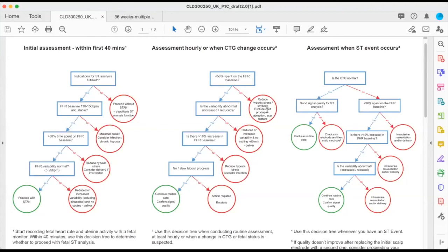There are many, many situations where we're not necessarily in a perfect world. Ideally, I need to have a check every minute. Okay, so I need to have a cross within every minute. That's the ideal situation, or in many books, the minimum situation. If you are having gaps in between your checks that are lasting more than 4 minutes at a time, theoretically, you can start developing hypoxic changes, especially biphasic changes, when you're not paying enough attention.